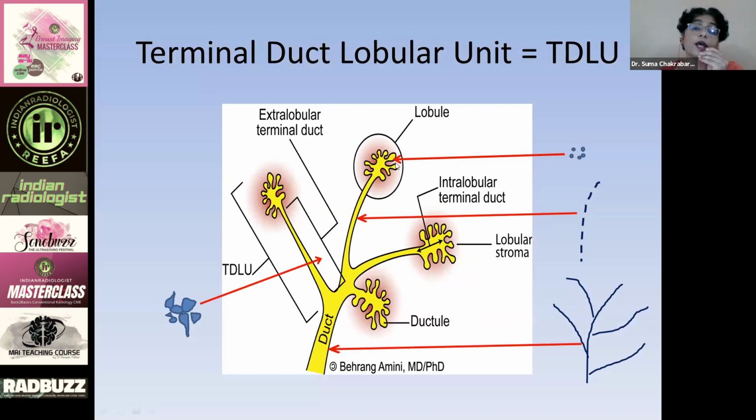and come from. So if calcification was to occur in the acini around these, it would form tiny little round dots, which would be the round or the punctate calcifications. If it were to arise from ducts such as this, then we would have linear orientation of calcification. If it were to involve the entire segment, an entire duct with its multiple branches and the whole of this, then it would give us a segmental pattern like a tree, a tree with its branches.